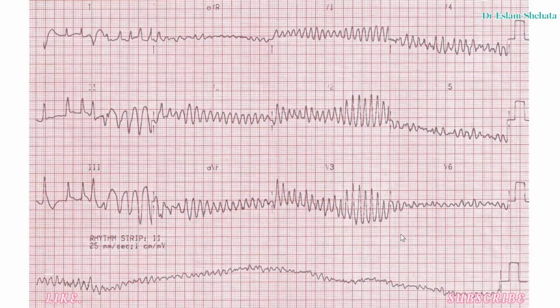One other thing I'll briefly point out on this particular ECG is that the rhythm strip down here is recorded after the 12-lead ECG. In most ECGs, everything is recorded simultaneously, but this one is recorded afterwards. And so we can see that we were in VT, and then it deteriorated into ventricular fibrillation, which we'll talk about next.